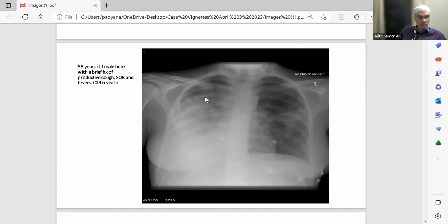Yes. So can anybody, based on that history and all that, please give it a go? Read the X-ray. Please, any of the participants.